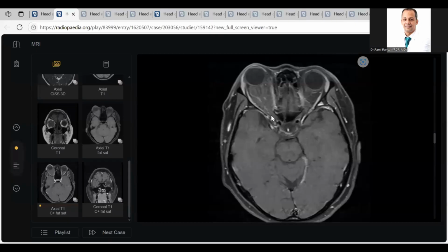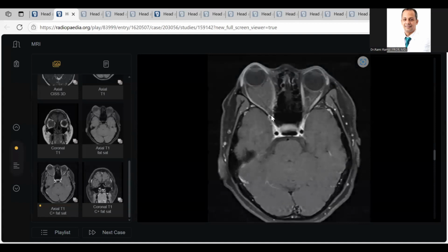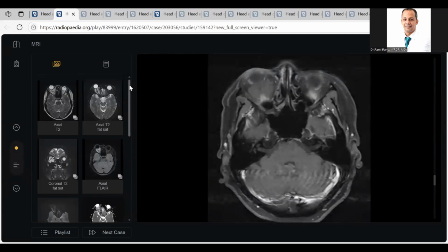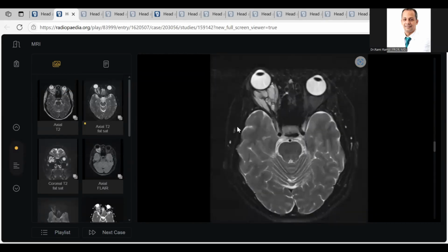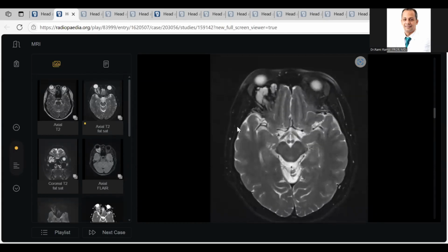So your final diagnosis is? I'm thinking about lymphangioma. I also want to check coronal images. Could you detect anything here to confirm lymphangioma? There are high signal areas, and there are multiple septations as well, a multi-septated area.